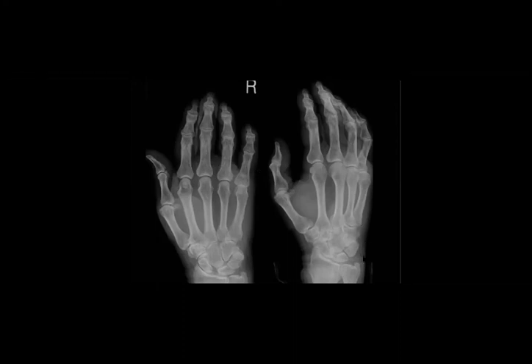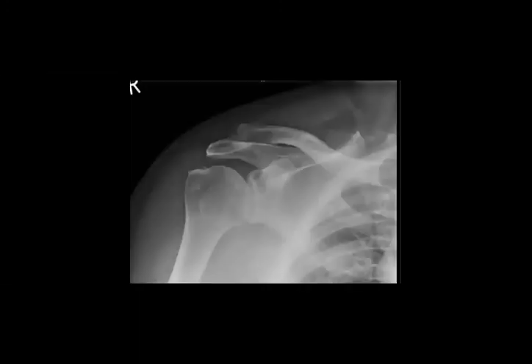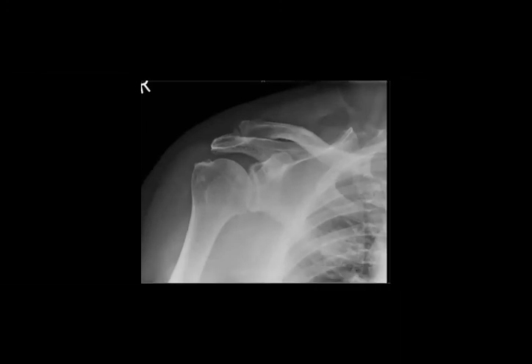So don't be very satisfied with this. I know that you are very happy that you caught it. I give you the 10 flowers, Amna, Nermeen, Sarah, Marwa. Okay. But don't be satisfied with this. There is another fracture here. Okay. I know that this type of cases are a bit difficult. So don't be upset. Try to train with me, and we will train together until we reach a good level. Okay. Inshallah.